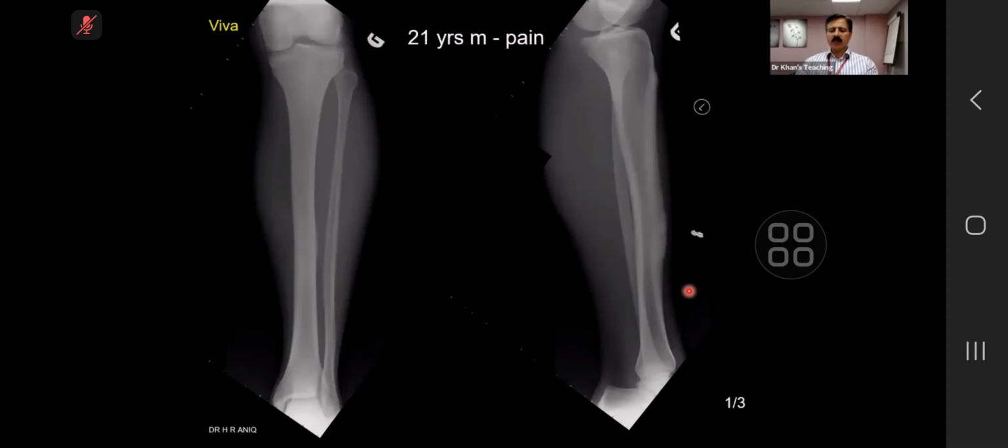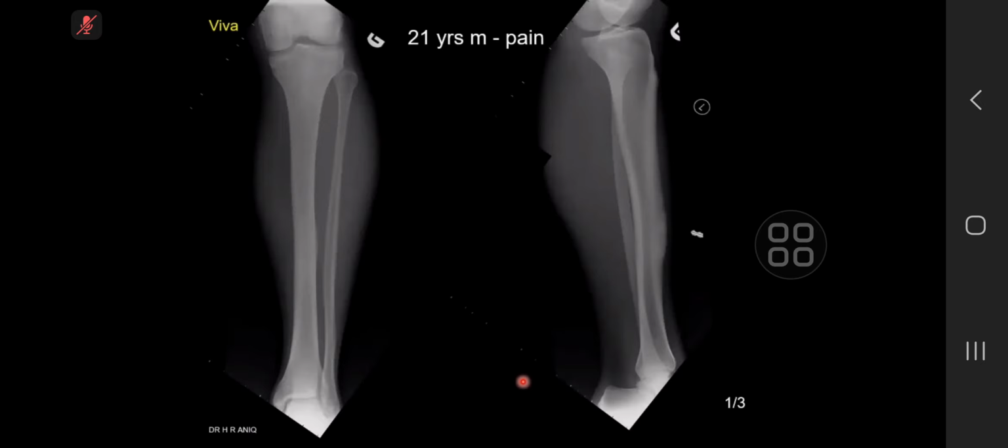Now, give me a bookish answer, not in this case, but if clinically speaking, if a young patient like 21-year-old comes to you with this kind of symptoms with tibia, what is your differential diagnosis? So I think given the size, possibly an osteoblastoma. It's more centered around the diaphysis. Okay, good. So you are talking about either an osteoid osteoma or an osteoblastoma.